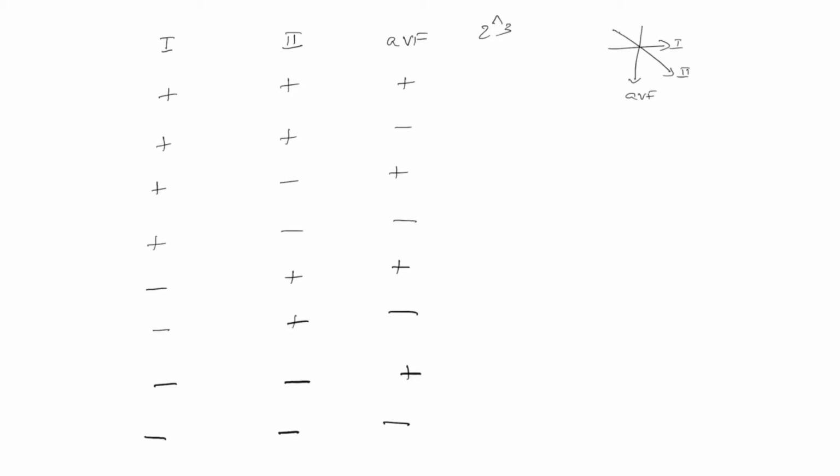Now, if we were to take the first scenario, let's do an additional thing. So for lead 2, if you imagine a line that's perpendicular to it, it would look like so. So any wave that's flowing towards lead 2 would fall in this general direction, otherwise it would be facing away. So if you look at it, lead 1 is positive, so that means the axis of the QRS would be somewhere here.